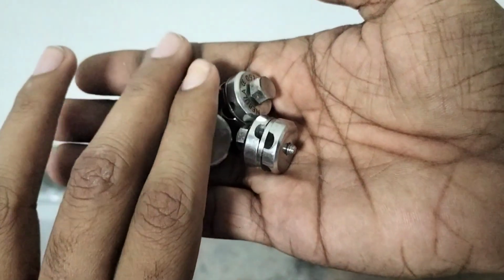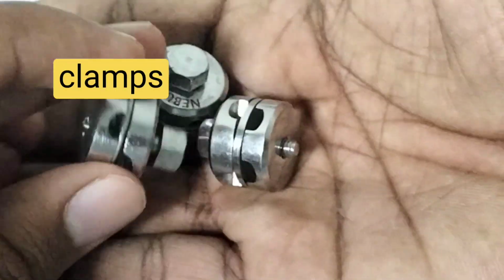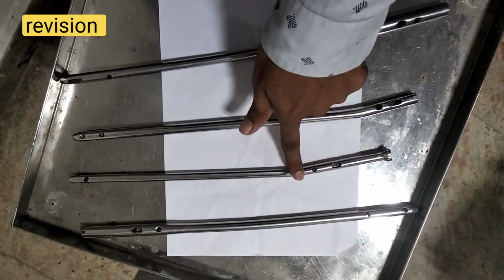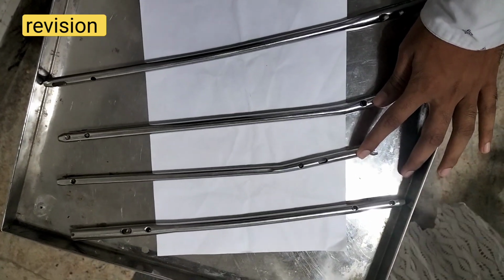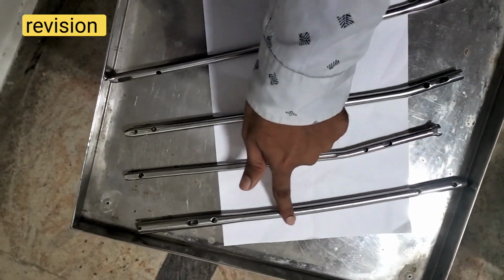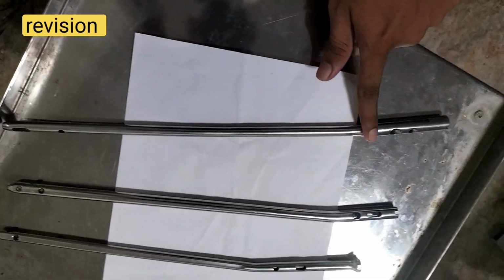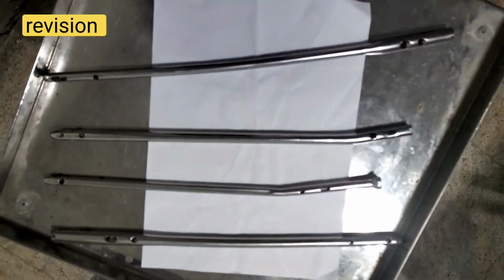These are the clamps. They are used for external fixation. Here, if there is a bend, this is Herzog's bend. It is a tibial nail, an intramedullary nail for the tibia. If the rod is present and it is bent or curved, it is for a fracture of the shaft of the femur. And here you can see this one is the PFN. PFN is for intertrochanteric and subtrochanteric fractures. It is a straight nail, while this one is a bent nail like this.